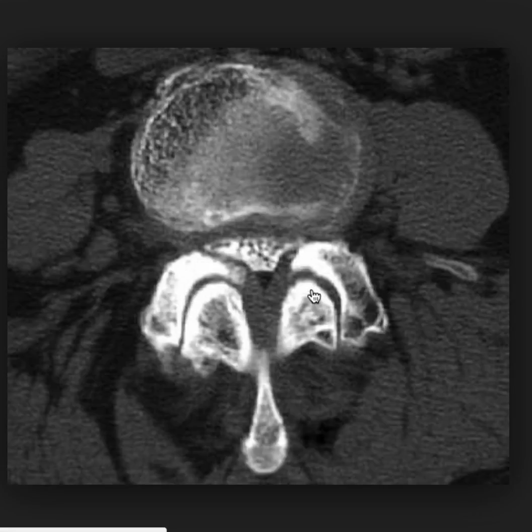You can see the whiteness on the edge here is much thicker than normal right here. That means those are degenerative. That's that osteoarthrosis of the joint, okay, of the inferior and superior facet here. So this area is where the spinal cord is, right here. You can see it, this small little area. Root coming out to the side.